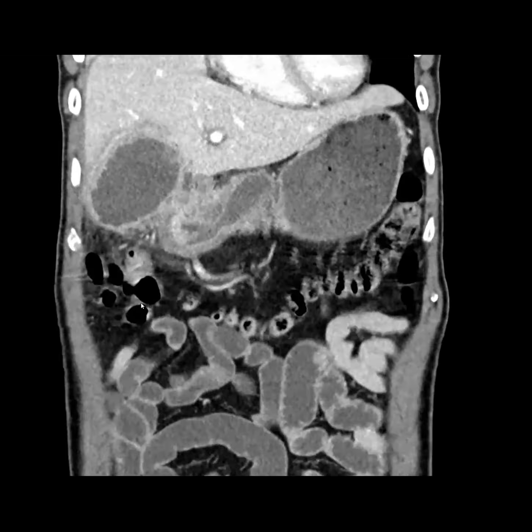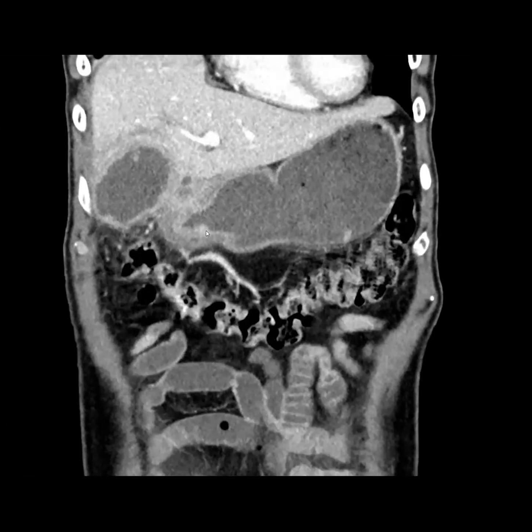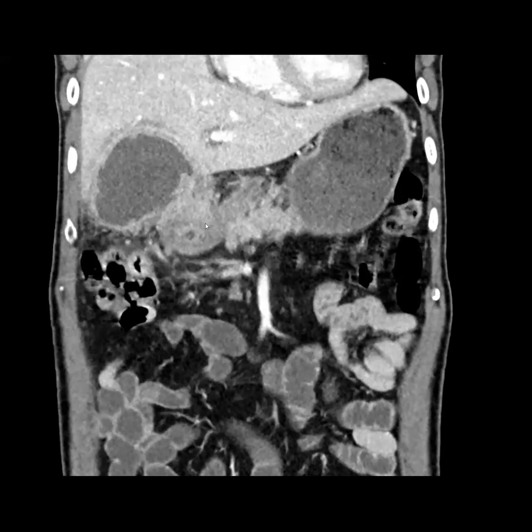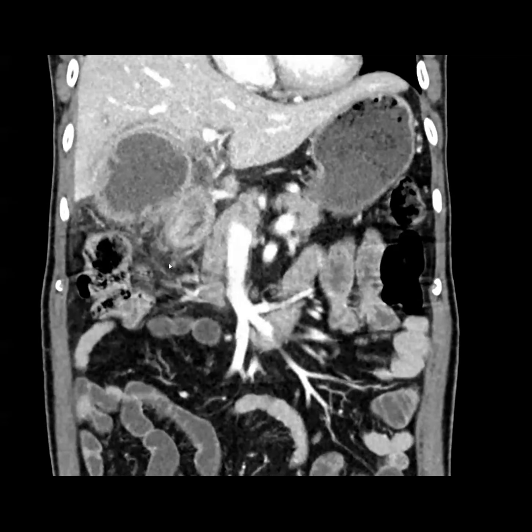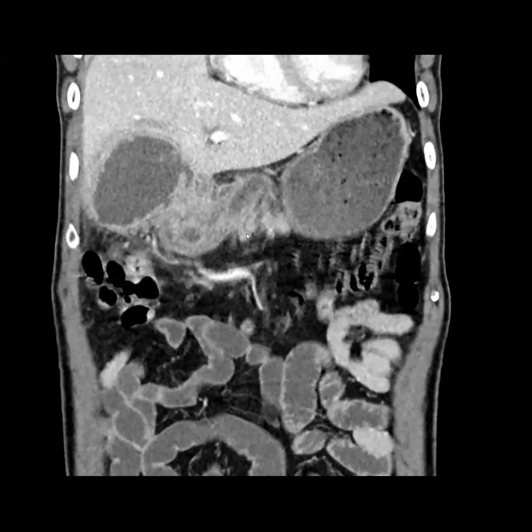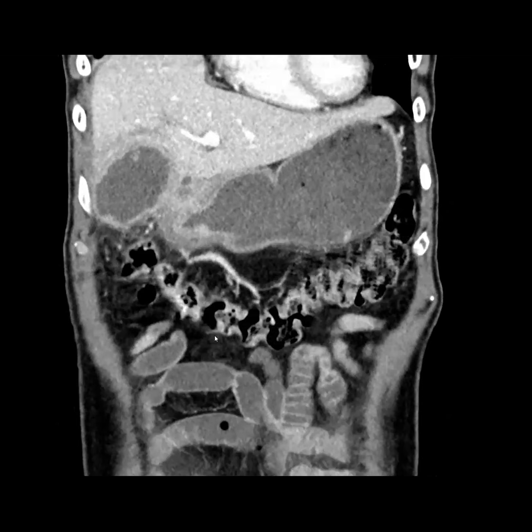Okay, good. So that was what was initially thought, and I can see why you think that. The gallbladder looks crazy. But I would like to draw your attention to the stomach. The pylorus of the stomach is actually pretty thickened here, and there's mucosal thickening and all this soft tissue. So when we started thinking about that, we wondered, if it's not just an inflammatory process, could there be a malignancy here?